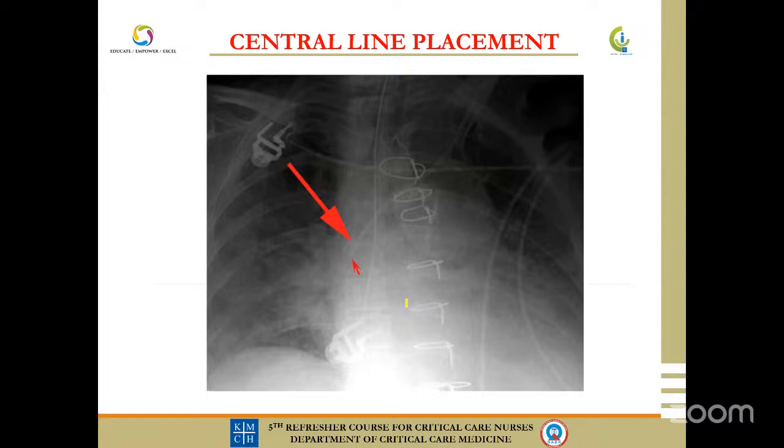Central lines, that's the other reason why we do chest X-ray. Here, I try to identify where the tip is located. The ideal location where the central line tips should be is the cavo-atrial junction. A tube which is lying more advanced can go into the atrium, it can injure the walls, or it can lead to endocarditis.